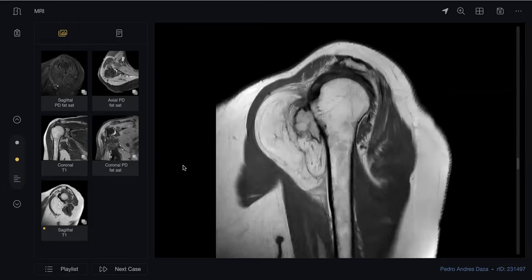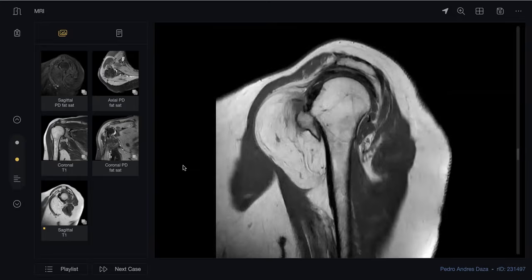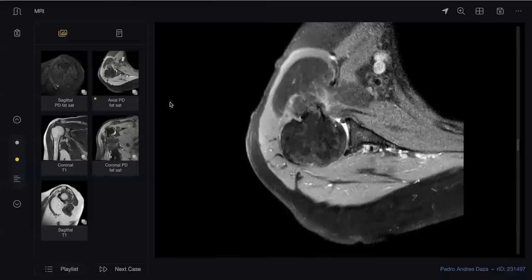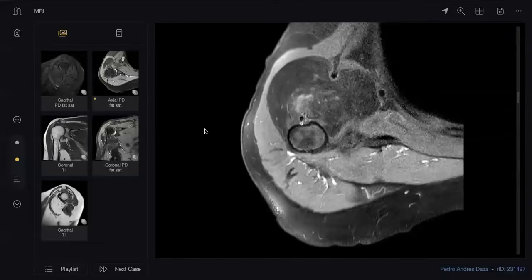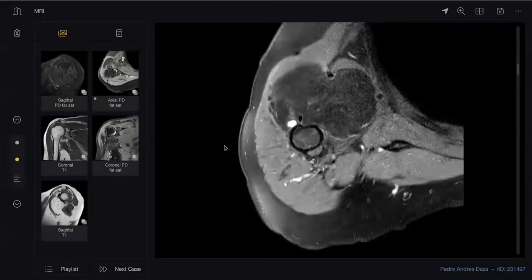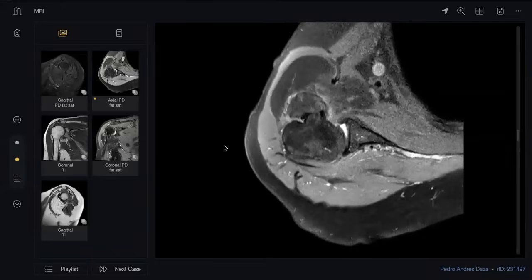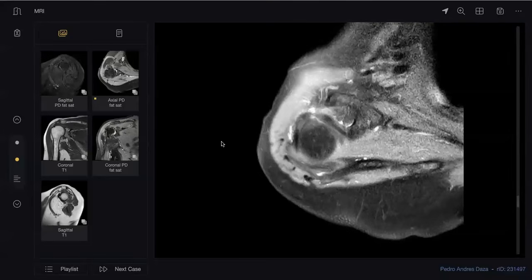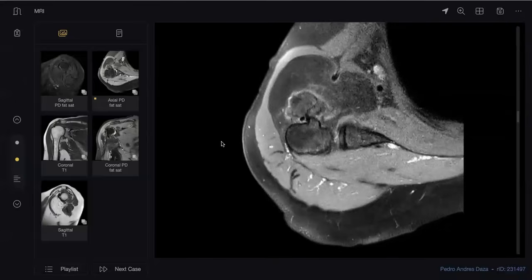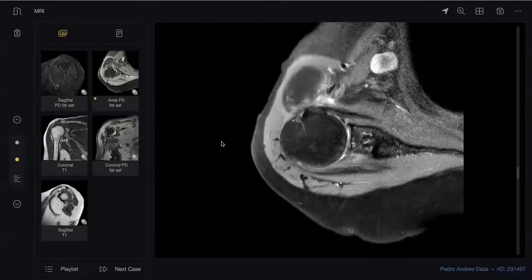One is osteochondroma and the other is a lipoma, and both are benign. This was the fat sat image I was showing you to show you that this is fat intensity, a completely benign lipoma, and it is called a parosteal lipoma. And this osteochondroma is also benign because the cartilage cap is too thin. I brought this case just to show you that in the exam there can be two benign pathologies lying side by side. So don't get confused.